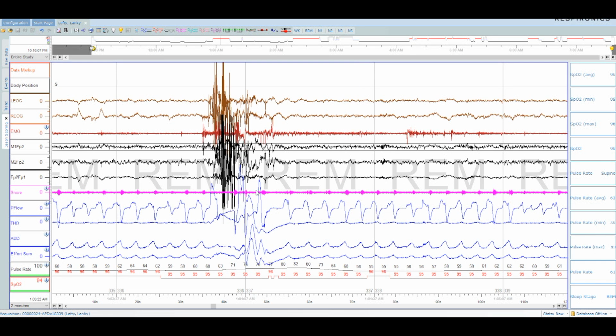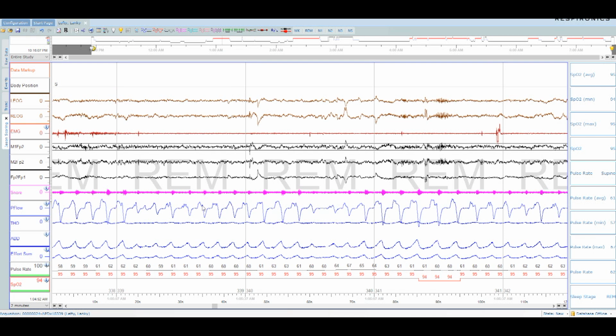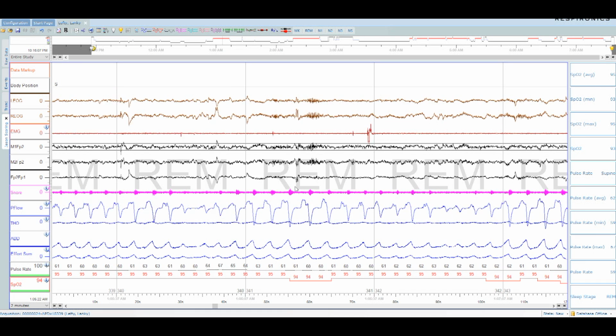No one knows why, except for people that do know why. I am not among those. So we have an arousal. I don't think that this is related to anything at all. That's my professional opinion.